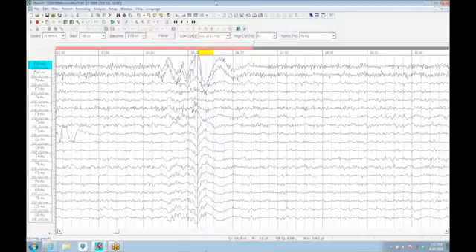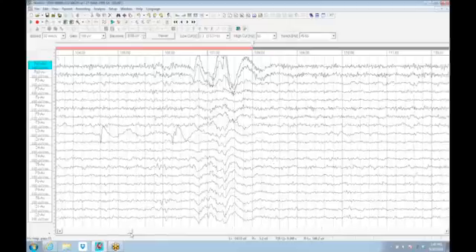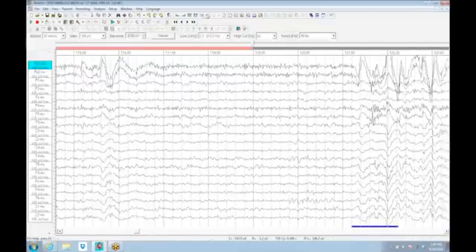So the localization of the slow wave is in fact correct with the Laplacian, and it's obviously an extra cerebral source within the linked ear because it's all in phase, which cannot be generated from inside the head. So not by the brain, at least. So the EEG here has remontaging capabilities.